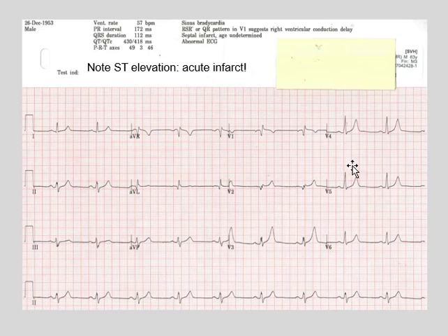So consider the possibility of an acute infarct, and I believe this patient is having an acute episode. Very subtle. There will not always be rip-roaring, but those ST changes cannot be ignored. Just be aware to look for the subtle differences, every bit as important as the big noticeable differences.